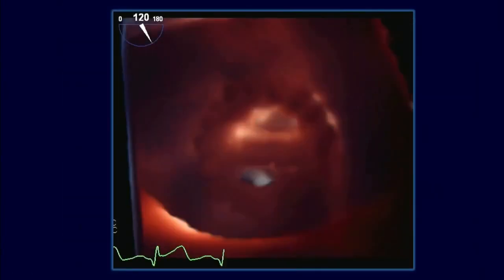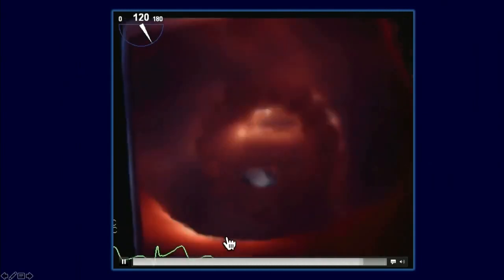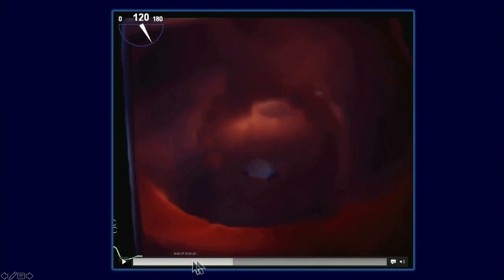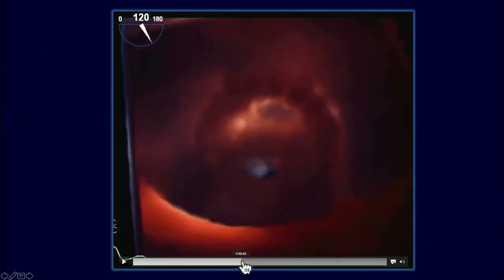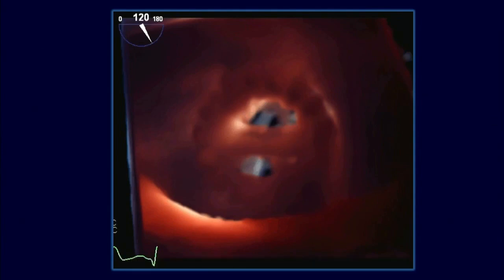And interestingly, not as pretty a picture as the ones that Dr. Lang has shown me in the past, but this concept of transillumination I think was quite interesting and valuable, because what we've done is we are looking from the left atrial perspective through this valve, but we've put the light source not looking from the LA down through the LV, but in the back, so the light is now from the LV shining right up to us.